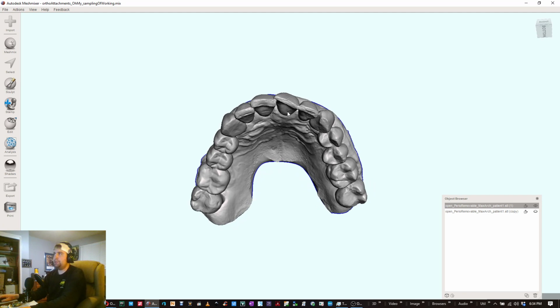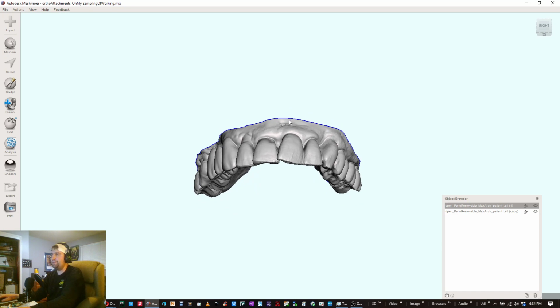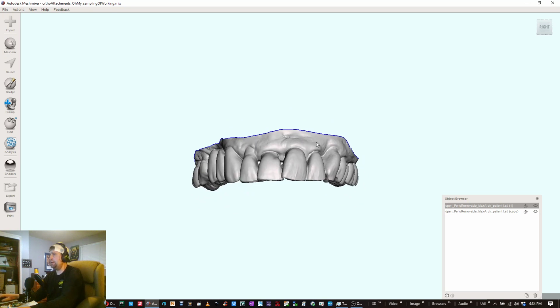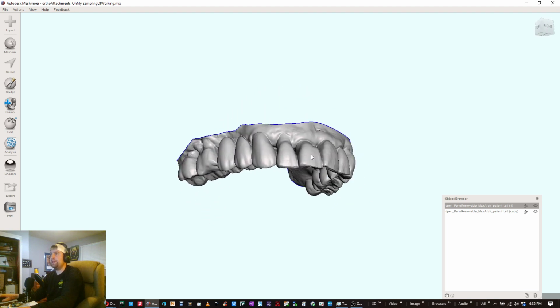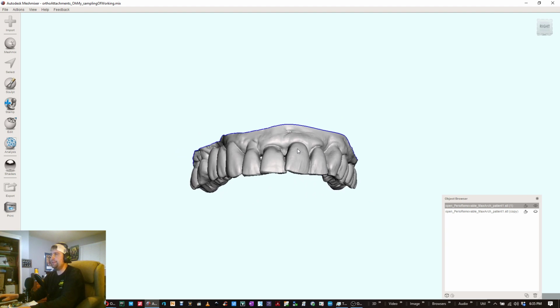But the typical ortho software out there is usually pretty expensive. I really haven't checked out the Blue Sky Bio ortho module yet. Usually their stuff is very reasonable, very fair, and I know Baron Gretter's on top of that, and he's always doing really awesome stuff. So probably check that out before you get too far into this. But this is just kind of like the beginning, you know. These are the first stages to get orthodontics moving in Mesh Mixer.